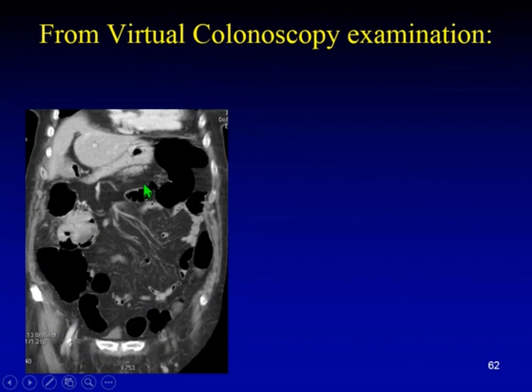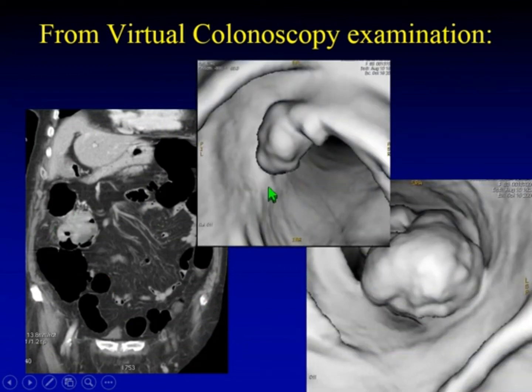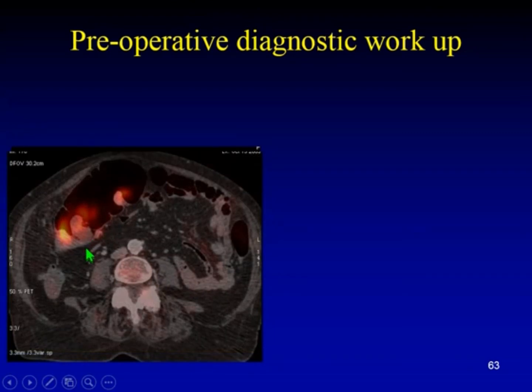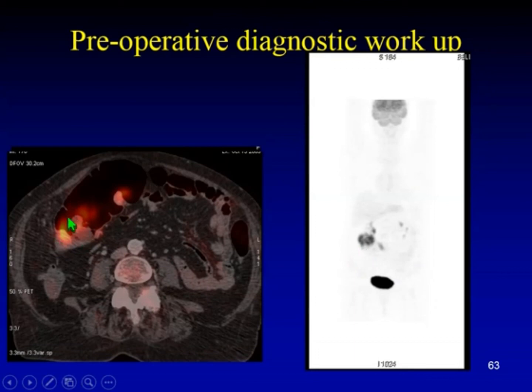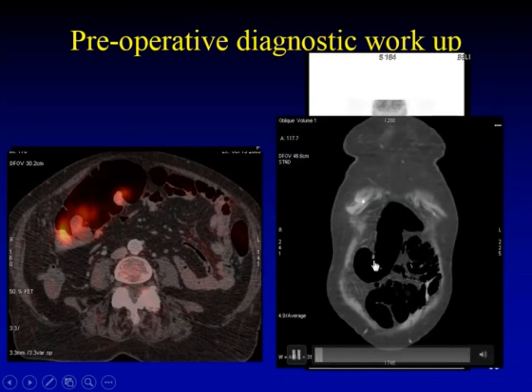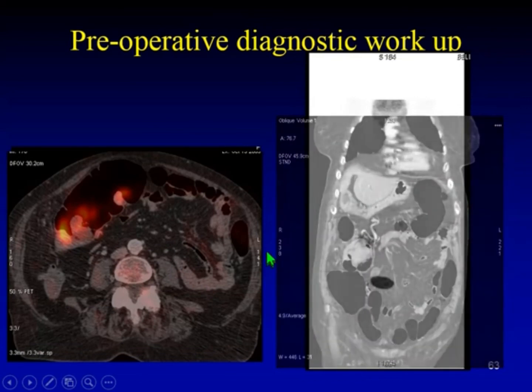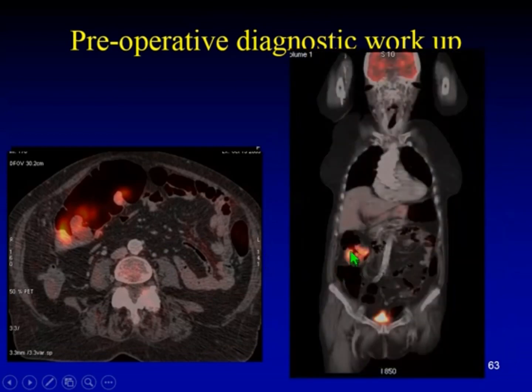In prone position, no contrast enhancement. In supine position, we moved to the contrast-enhanced colonography because we found a solid mass protruding on the right side of the colon. This is a contrast-enhanced colonography. In reality, this examination was a part of a PET contrast-enhanced colonography where we characterized a solid mass right-sided in the right part of the colon here. The hybrid image just described these positive findings.